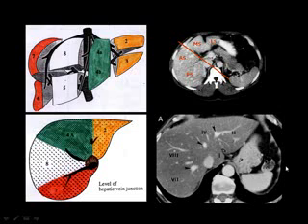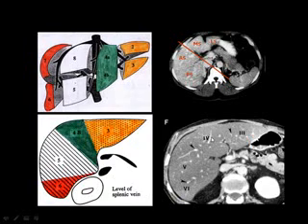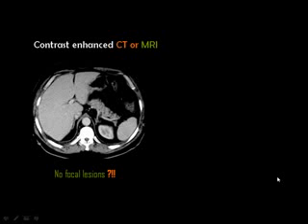Then look at here. Which level is this one? It is the superior one. Why? Because the inferior vena cava is adherent to the liver. Then the superior one is the segments above: 2, 4, 8, and 7. Then this is the inferior segment where you can see part of the region of the pancreas. Then you have segment 3, segment 4, segment 5, and segment number 6.